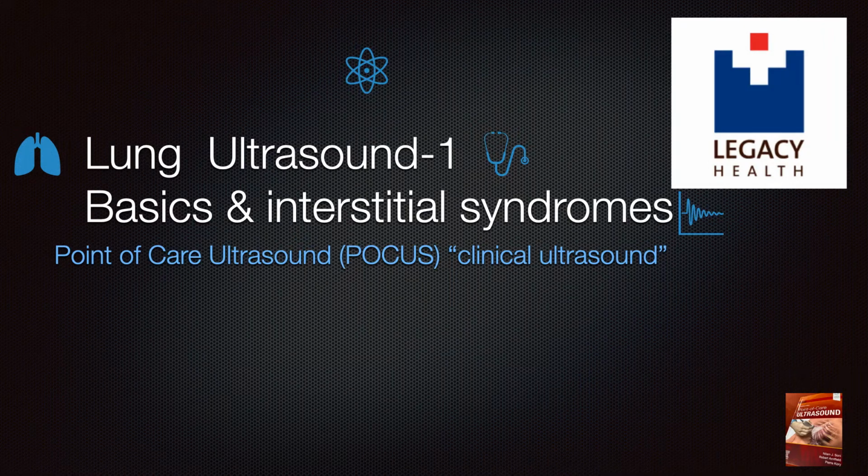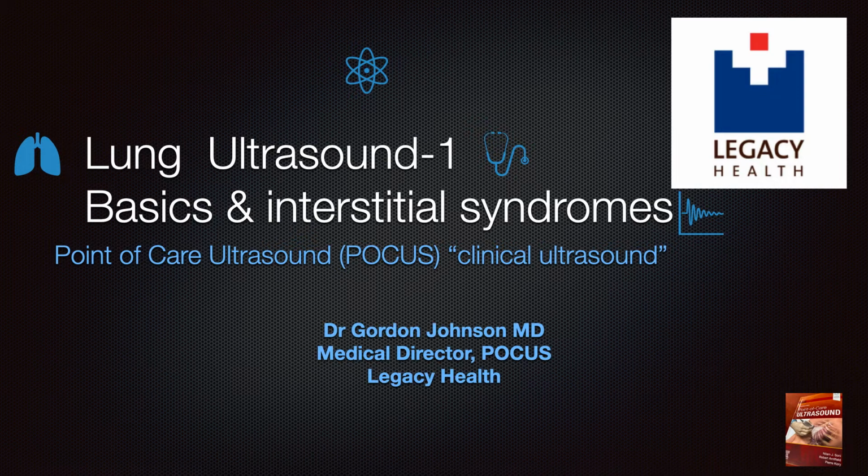Welcome to the module on basic lung ultrasound and interstitial syndromes. This is module number 1 for lung. Pleural effusions and consolidations will be covered in module number 2 of lung. I'm Dr. Gordon Johnson.